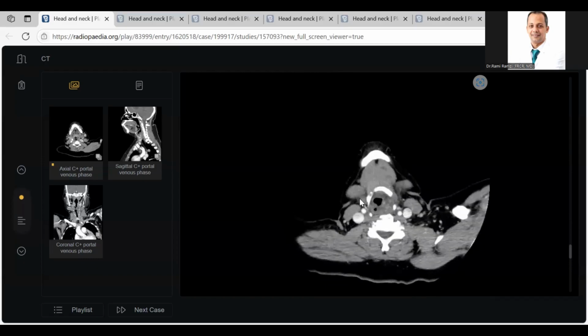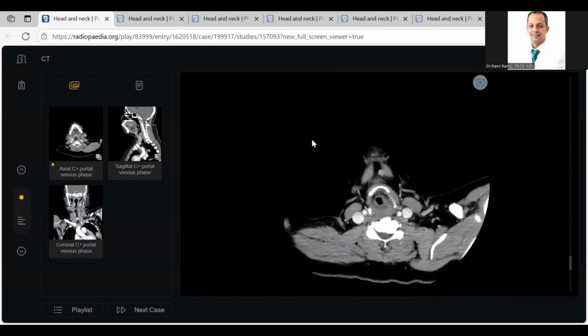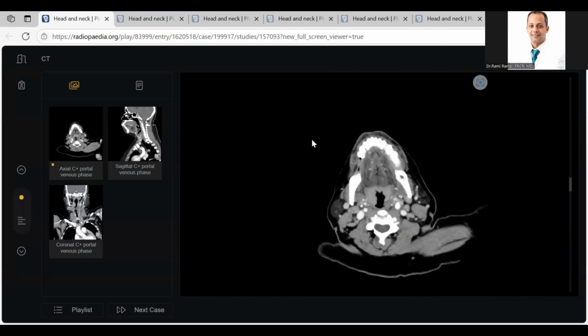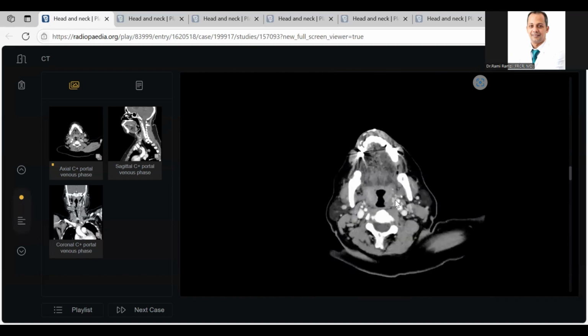Thank you, doctor, so much. This is life-saving. You picked it up well, but you hesitated in the middle. Don't hesitate. Please, my colleagues, take a moral from this case: walk behind your doubts. Here there is an abnormality in the axial. Where is the abnormality?